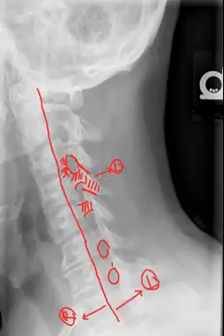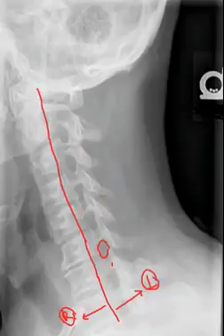So when we think about the borders and what could potentially cause intervertebral foraminal stenosis or narrowing, we have to consider uncovertebral joint arthrosis, intervertebral disc herniations, as well as facet joint arthrosis. All right. So we've identified the intervertebral foramen, we've identified the pedicles, the left pedicles at least, the left articular pillars, and left facet joints.